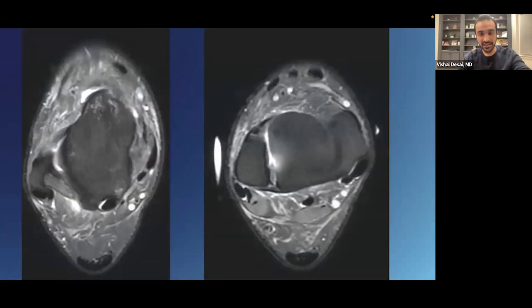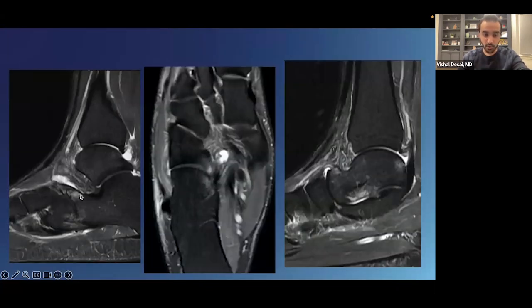So on MRI, because the injury pattern is also an inversion injury, the ATFL may get injured in this process, which we have here. The syndesmosis, because this is a separate mechanism, should be intact as it is here. And then the important sequences or important images. In this case, this was the one that we had. We have that avulsive edema at the anterior process of the calcaneus. It was not fractured, but this is an injury to the bifurcate ligament.